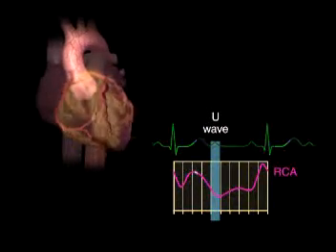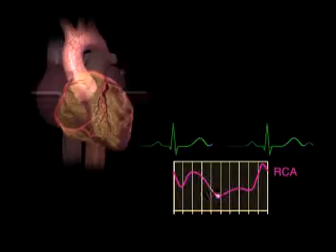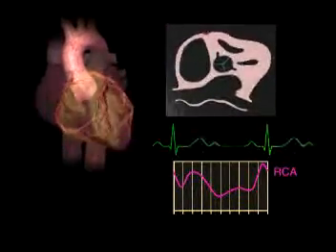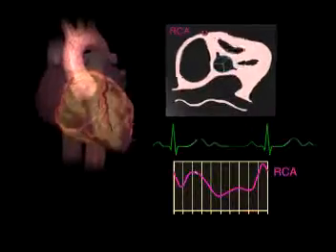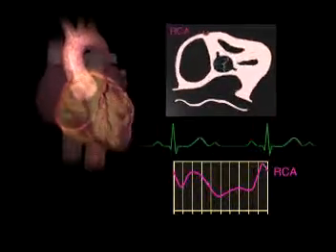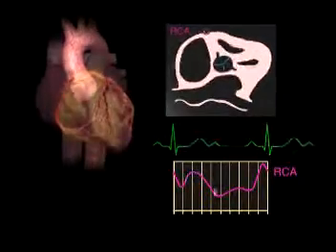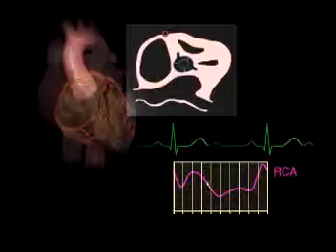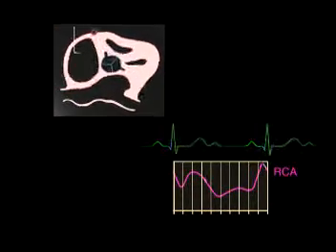Extracting a cross-sectional image of this beating heart in the midsection of the RCA shows a view of the RCA in the area where it experiences maximum displacement. This view allows a closer examination of RCA motion. In the exact location and orientation, images are acquired by both CT and EBT technologies.